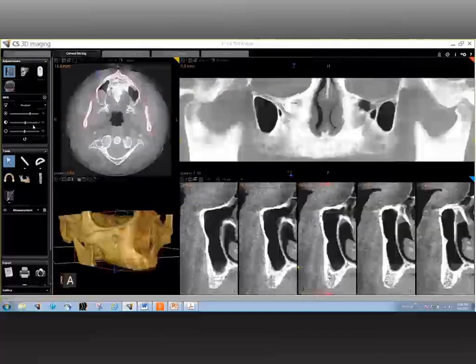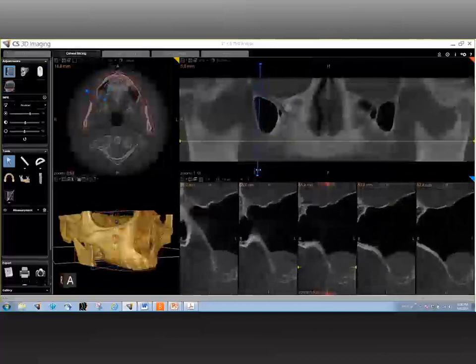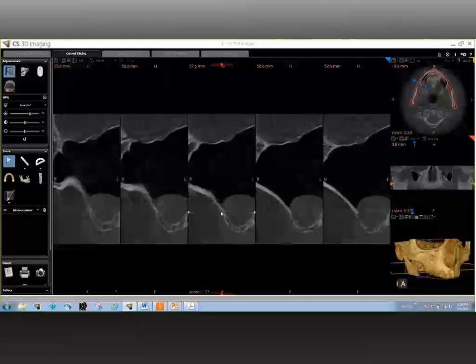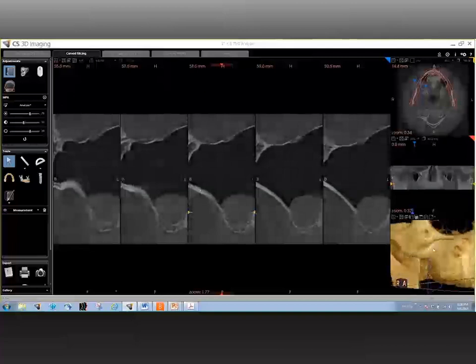Well, if you look at the cross-sectionals, you can clearly see, I'm going to go back all the way to the posterior area, and we would use the traditional way of interpretation. So you have the cross-sectionals, which I tend to refer to as one of the most important sections that you would use for implant surgery. And these shots show the cross-sectional view of the crestal ridge, of the jaws, and by that what I mean is I'm getting the buccolingual aspect, which is a third dimension that is missing in a two-dimensional radiograph.